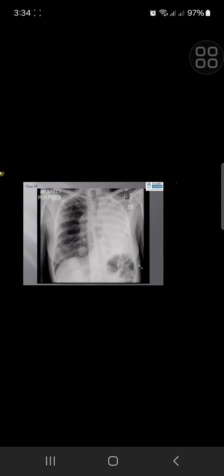So patient, other different, sorry, doctor? Yeah, go on, other differentials, please. Other differential would be post-pneumonectomy changes, but I don't see any obvious rib defects, particularly posterior rib defects in the left side, to support that finding. Other than that, mesothelioma would not cause tracheal shifting. Actually it would be more of a static and frozen chest. So I think that the patient requires a CT thorax for further evaluation and comparison with any previous image.